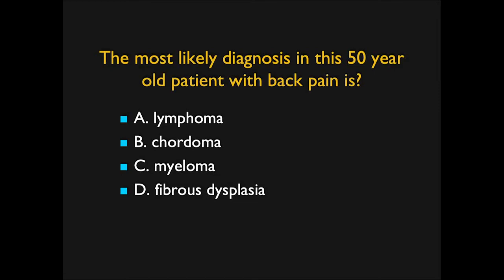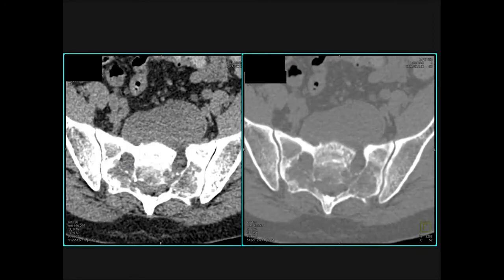This patient had back pain. When you look at the lesion on the soft tissue images, there's a large presacral mass which really extends posteriorly into S1. It's infiltrating. You can see on the bone windows the bony infiltration, the soft tissue mass.